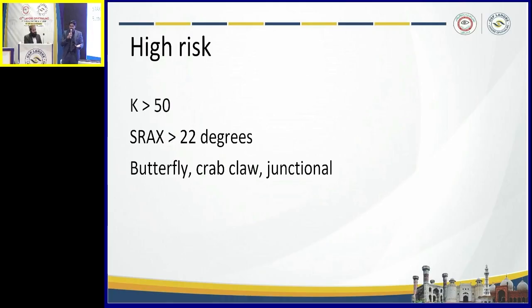What tangential does, on the other hand, is it makes very small circles on various different parts of the cornea, and then it takes radii of curvature from those smaller points. Because it's taking so many points, it's actually less prone to decentration because of angle kappa and all of that stuff. So it also benefits to go and look at the tangential curvature maps, and that makes it easier.